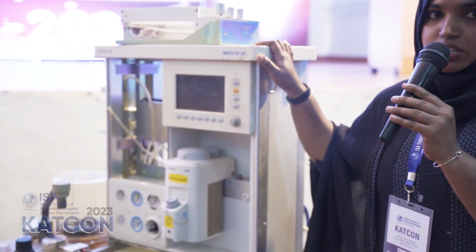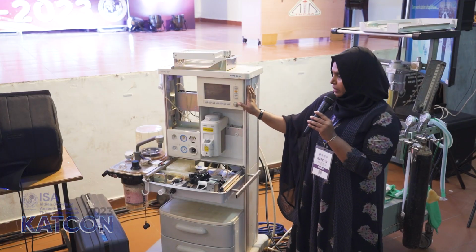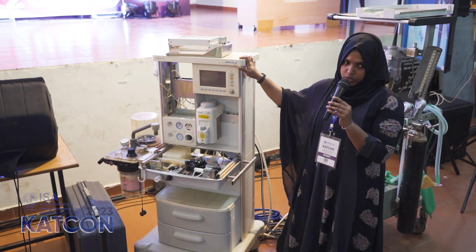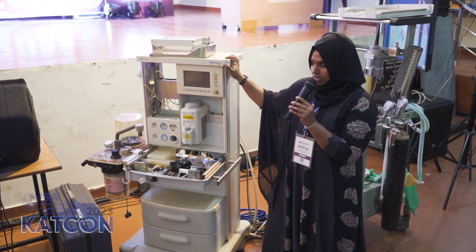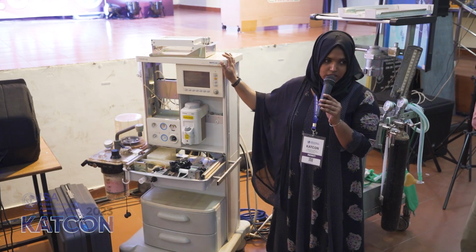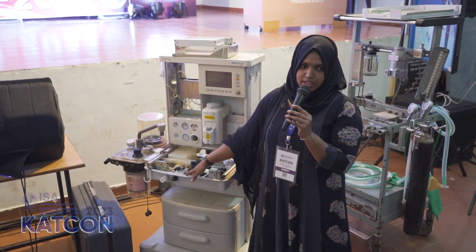Actually, the anesthesia workstation is our masterpiece when we are working in the field of anesthesia. Once I enter the OT, I will check whether the machines are moving, where the anti-static rubber tires should be working. It is a safety measure for an anesthesia machine. And I would like to tell you one thing. This is not the anesthesia machine. This is the workstation, which includes ventilator, vaporizers, flow meter, pressure, gas outlet, everything.